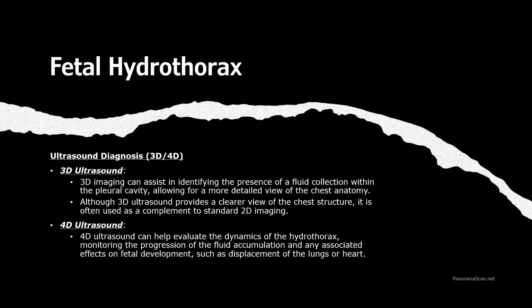For example, it helps in visualizing any displacement of the lungs or heart, which can be crucial for understanding the severity and potential impact of the hydrothorax on fetal well-being.